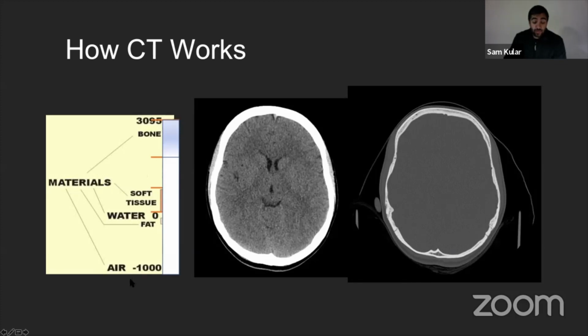And it's the same thing if we were looking at a CT of the lungs. We would shift this scale down to the bottom where they had the air window, and it would black out all the soft tissue, but we'd see the lungs very nicely. And so we shift these scales dynamically as we're looking through the scans to look at the various aspects of the tissue and the bone separately to assess the whole head entity.